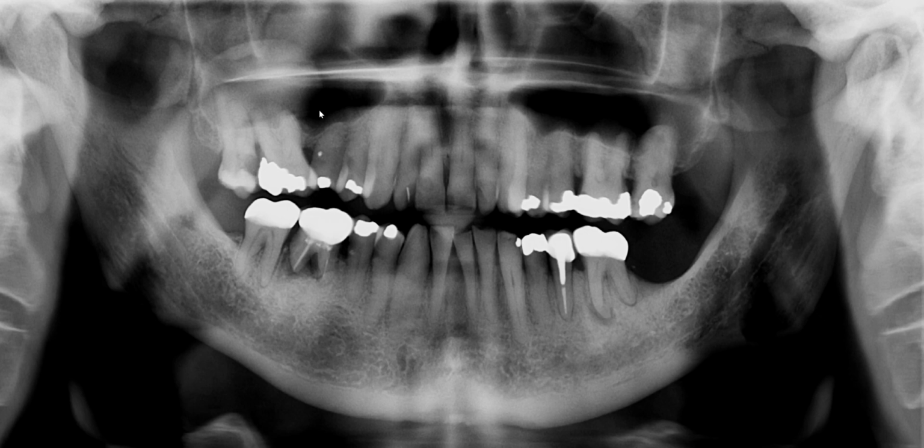This might be a little bit more tricky, but the second area of concern was this thin radiolucent line, which appears to be right at the base of this coronoid process. If you look over to the other side, for your reference, that might help you to determine what that is.